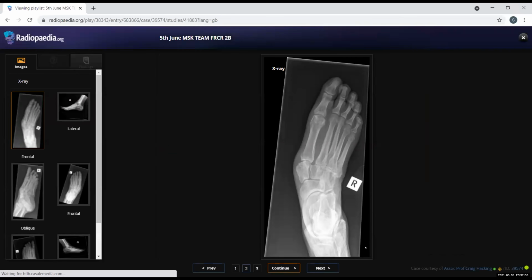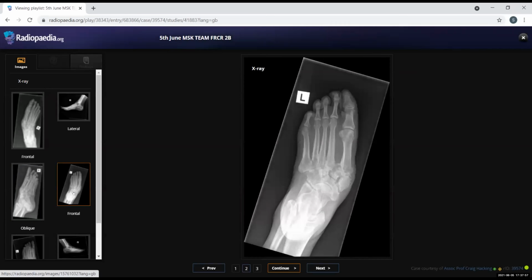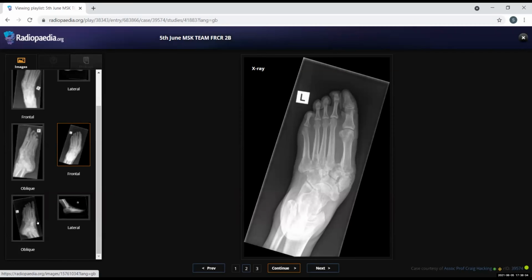This I showed you, and I told you multiple times the reason: there is no history of trauma, but you rightly picked up the Lisfranc dislocation. Yes, but this is, as you said, Charcot, okay?